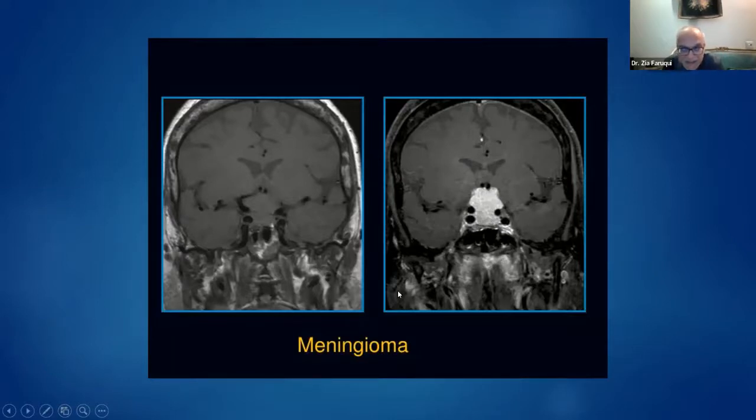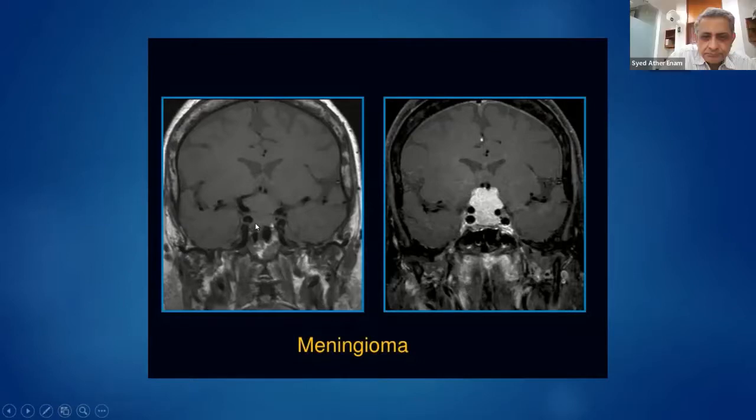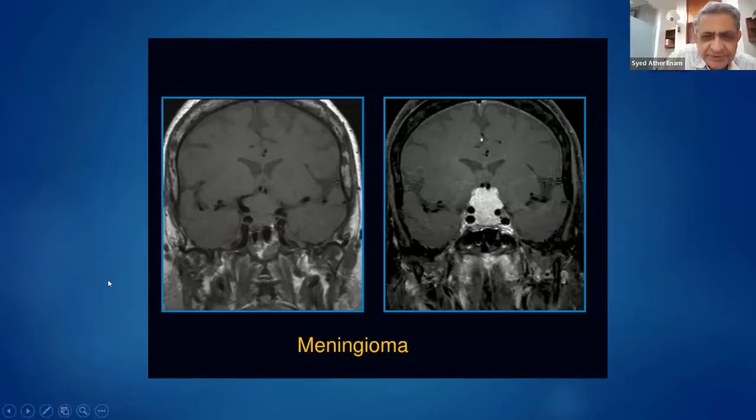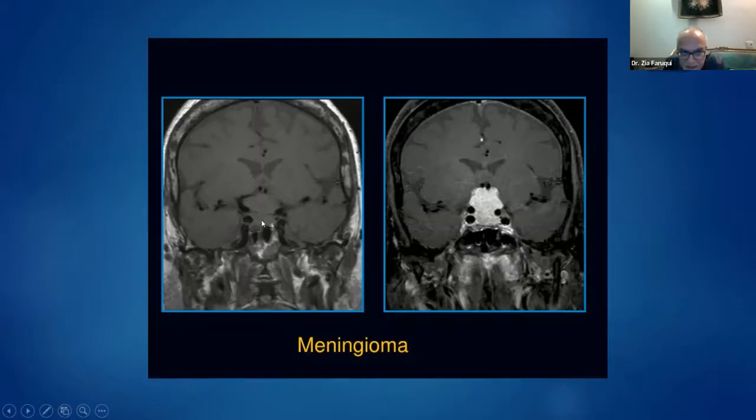As I said, the bigger things get, the harder it is to tell where they're coming from and where they're going. But again, with the eye of faith on the pre-contrast, sagittal would give us a better idea in this case. Sagittal would definitely. I don't have the sagittal, but if you look at the pre-contrast imaging, you can see a trace of a boundary between the sella and the lesion. There's a difference here, but post-contrast, hard to make it out. Right.